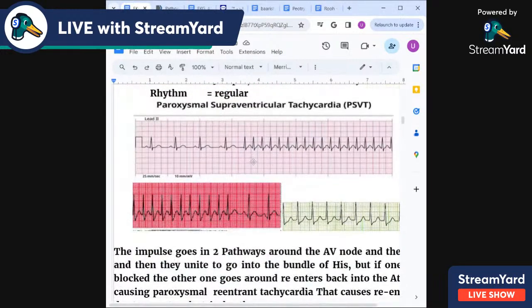So here, this is the EKG. This is the normal rhythm. It starts and it stops suddenly. Then it starts here, this one, a regular rhythm: atrioventricular nodal reentrant tachycardia. All the components of the complex are present, PQRST, but the only thing is the rate is fast.